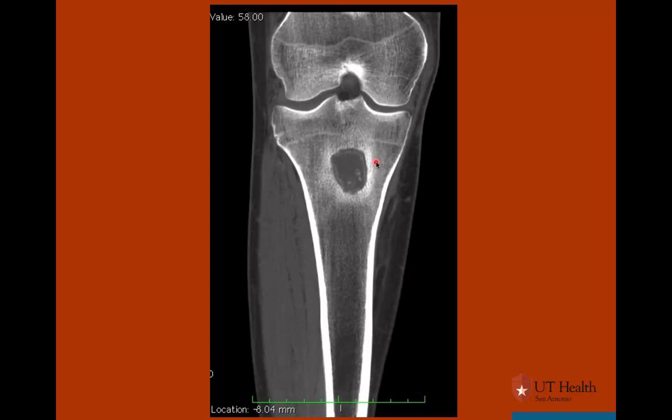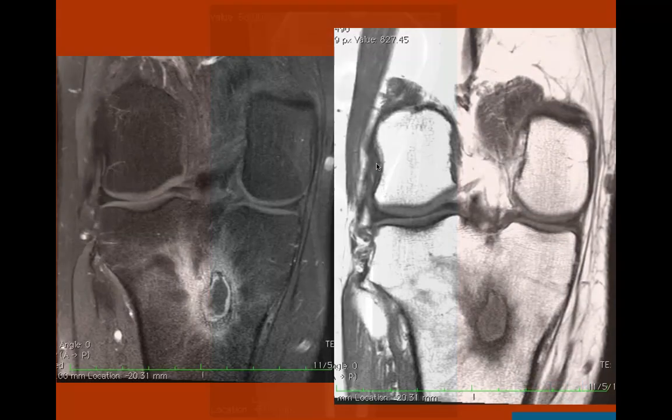This is a subacute osteomyelitis, also known as Brodie's abscess. Brodie's abscess has very characteristic MRI findings. These are coronal T1 fat-suppressed post-gadolinium and T1 weighted images without fat suppression. What is characteristic in MRI of Brodie's abscess is the 4 rings or 4 levels.